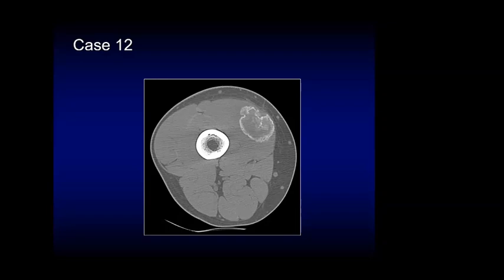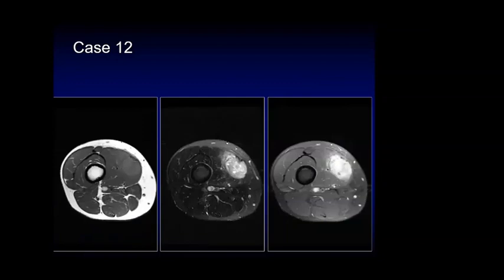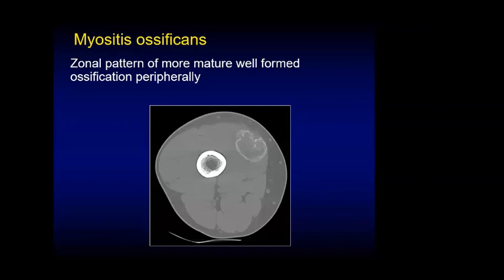Professor, it could be calcified. The MRI sections showing an iso-intense and enhanced lesion. The diagnosis would be myositis ossificans. Yeah, you are very confident.